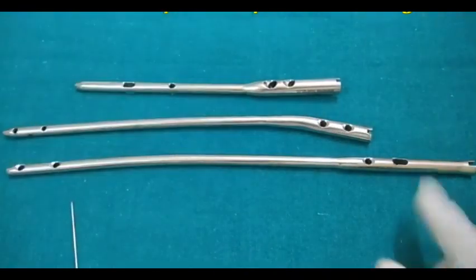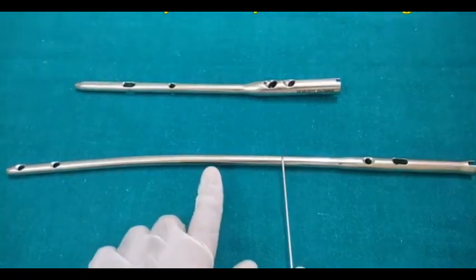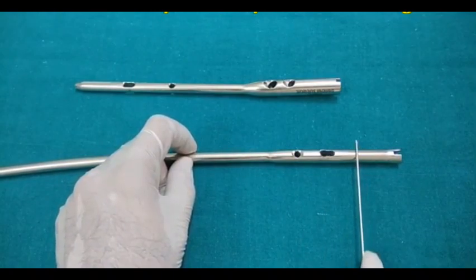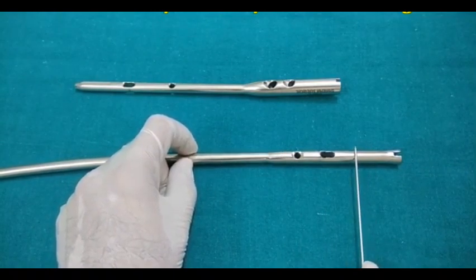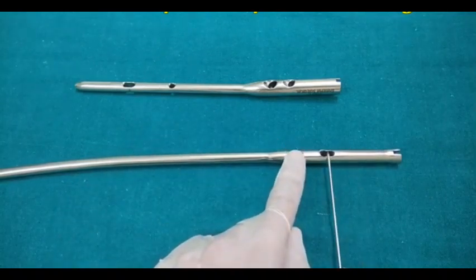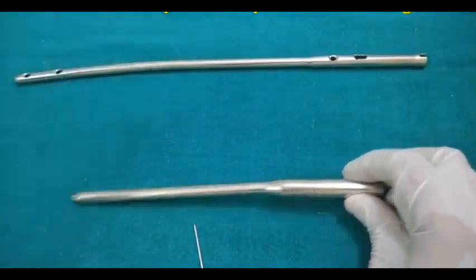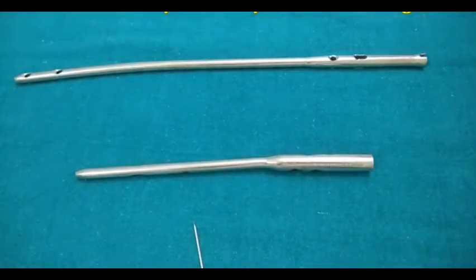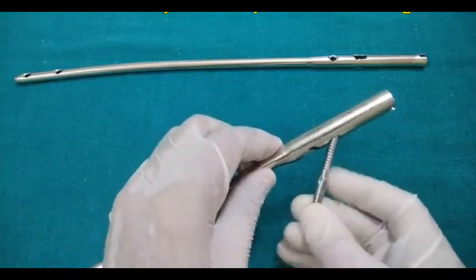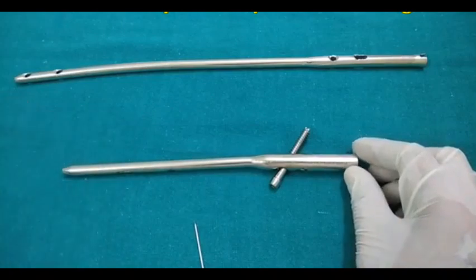Now, one thing in the femur: if you have a diaphyseal fracture of the femur, you fix it with this nail. But if there is a fracture above this hole, in the intertrochanteric region or the subtrochanteric region, this nail is not going to help because the holes are quite distal to the fracture. So for this, we have the proximal femoral nail, which has now replaced the DHS. They have a different type of screws for interlocking in the proximal fragment. So this is actually the proximal femoral nail.